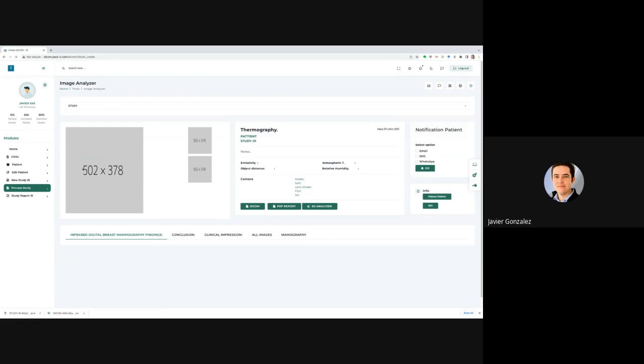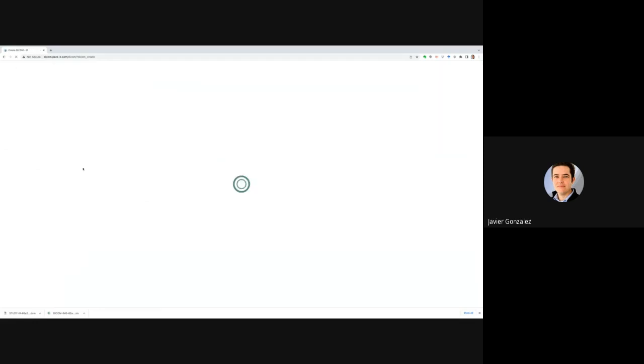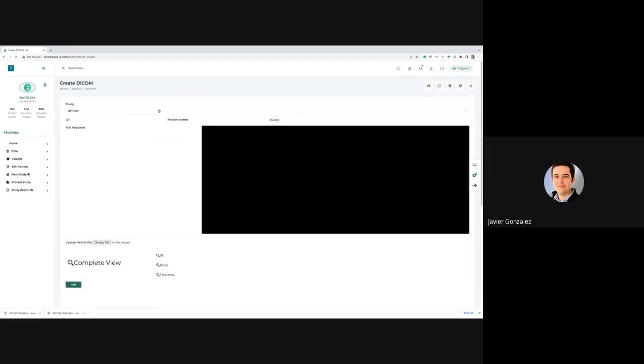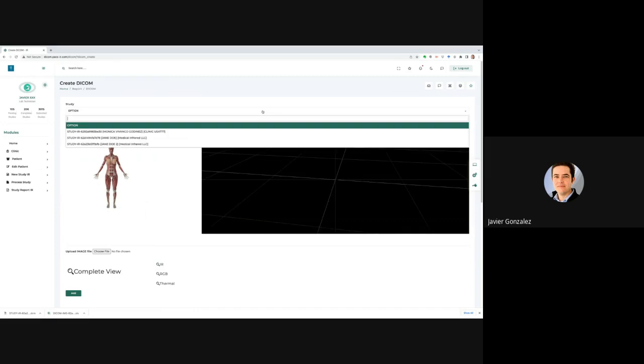I need to select the patient because I have several patients, not just one. Okay. And so here's the one we just did.